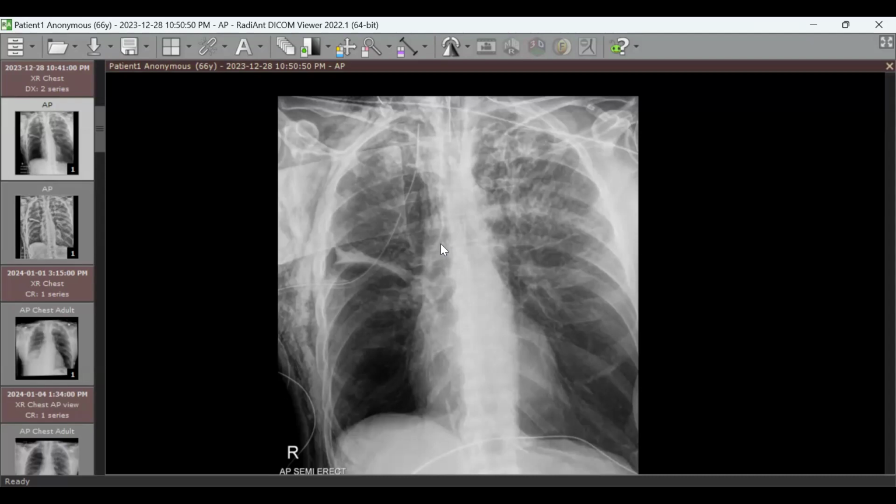If it is a PICC, a peripherally inserted central catheter, which you want to use for a longer time, for chemotherapy, you would have it at the cavo-atrial junction. If you have a central line for hemodialysis, you want to see it inside the right atrium, but not touching the wall, to avoid arrhythmia. Also, you don't want the central line higher up in the superior vena cava or the brachiocephalic veins, to avoid thrombosis.